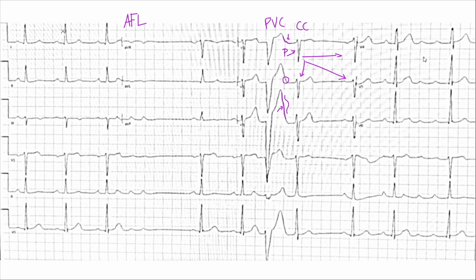Okay, what else am I seeing on here? All right, so this really jumps out at me. Here we're talking about lead 1 and lead 2. In lead 1, the height of the QRS, the amplitude, is larger. It's obviously larger than lead 2. That should never happen. Not really. I mean, you can have instances where the heart is twisted a little bit, or maybe it's completely on the opposite side, right? You can have strange phenomena, but for all practical purposes, when we're talking about things being normal, you should not have lead 1 QRS taller than lead 2.